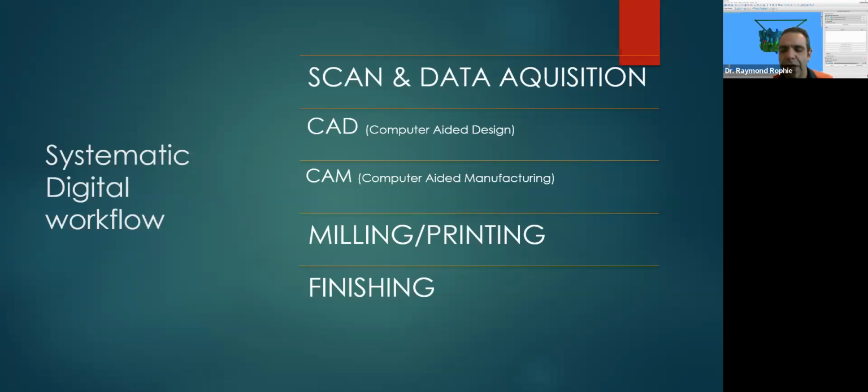For this case, I wanted to just continue what Dr. Mithley explained on the last webinar. He was presenting about importing an STL file, which is a file that you imported from your scanner, either desktop scanner or intraoral scanner, right?